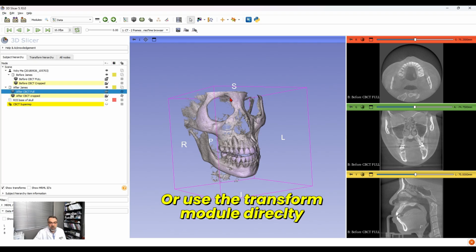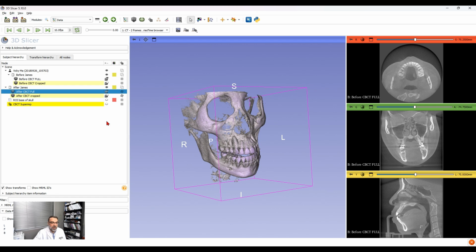And watch, wow, that's magic. You saw it, how it moved. It's crazy. And then go back and harden. Now let's test. We're gonna see whether we did a great job or not.